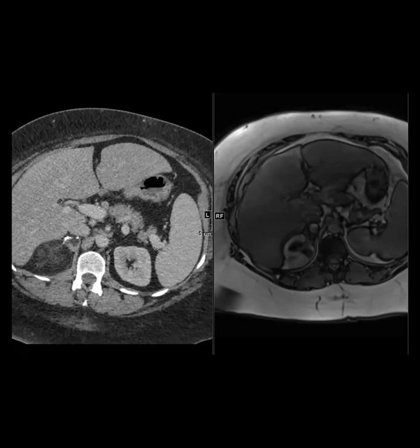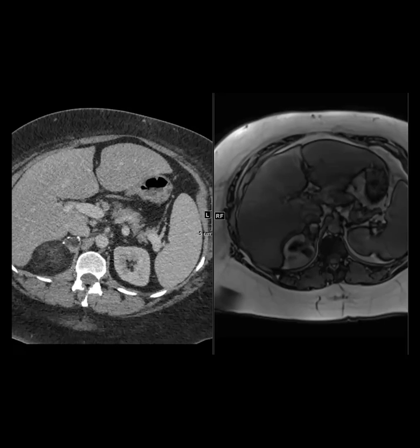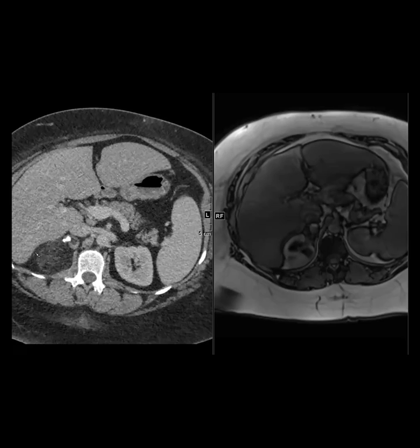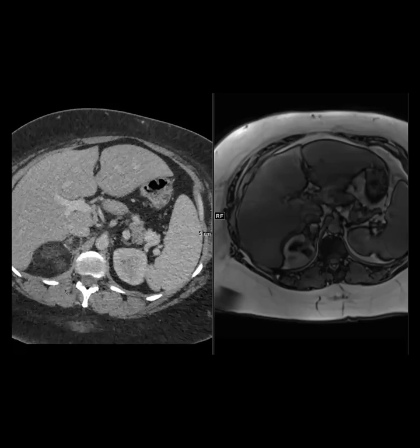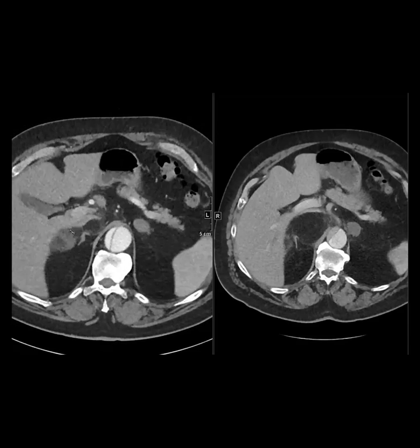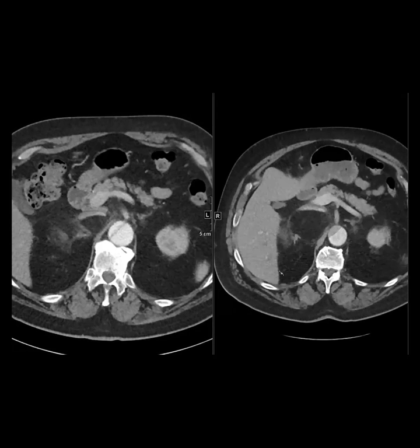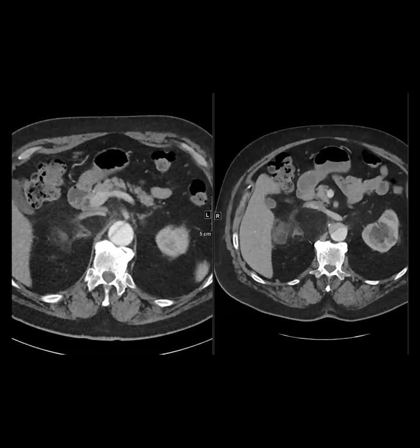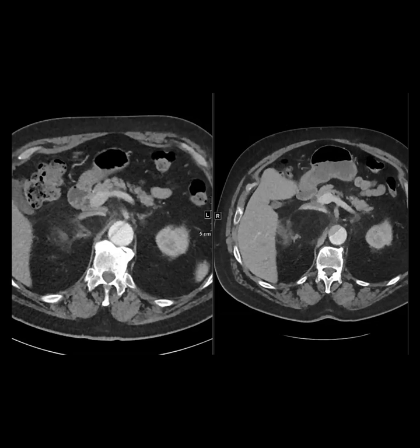I've had some cases that are a little squirrely. One of the key things that I picked up over the years is the first one you showed is pretty well circumscribed around the margins of the lesion, whereas the second one was a little bit irregular around the margins, and it would have made me a little bit more nervous. You can tell a myelolipoma on biopsy. And for liposarcoma we have to send for MDM2 to help confirm it.